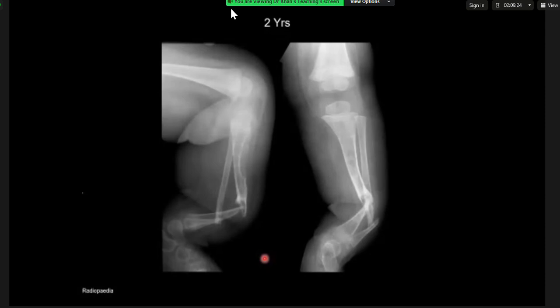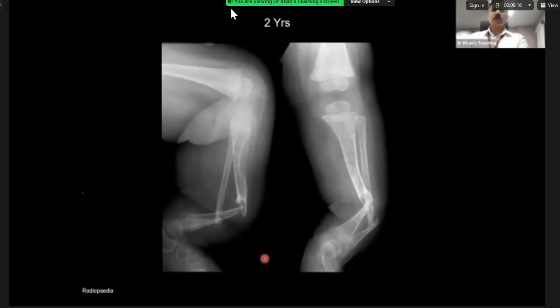Section, I can see there are a few soft tissue... No, not here. So don't worry. There is nothing in the soft tissues in this case. This particular entity, how do you describe it? What happens in neurofibromatosis? So that's why I've confirmed your diagnosis is correct, but you tell me why.